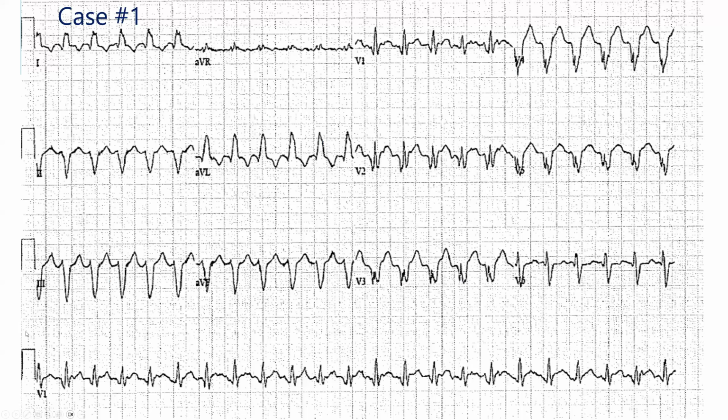Well, as you go across the rhythm strip at the bottom, you see that you have an utterly constant RR interval. So you're not seeing any differences in timing that might have helped you there regarding ectopy and so forth. Now, if you take a look at the morphology going across the rhythm strip, so one lead across the whole thing, yes, admittedly, there are differences in the morphology, but they are arguably subtle.